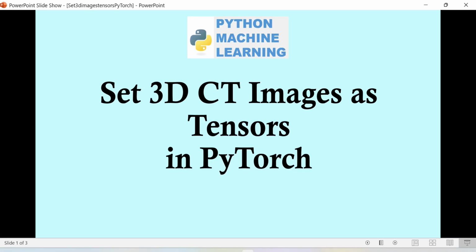Hello, in this video we show how to load 3D images, in this case CT images, into PyTorch and create them as tensors.